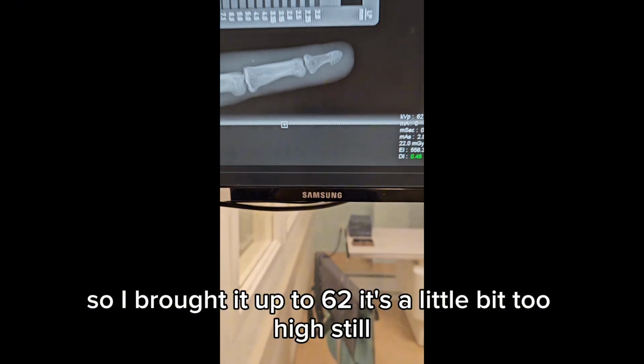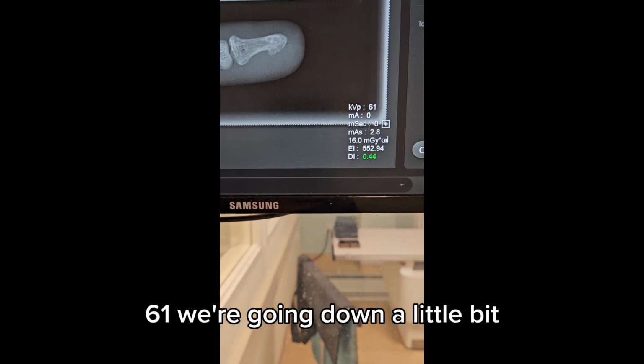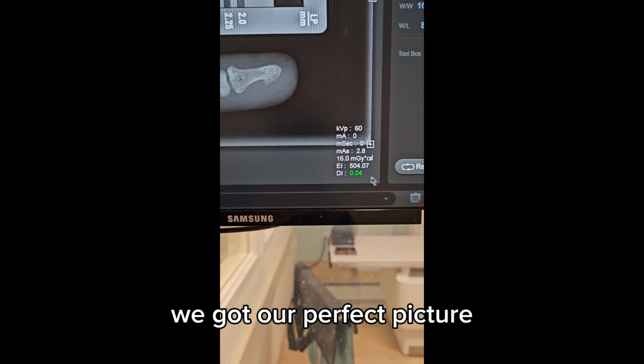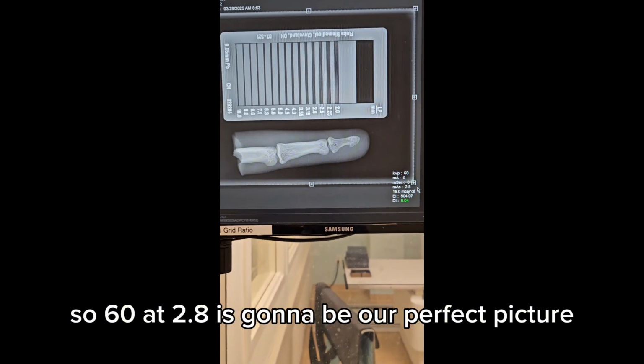It's a little bit too high still. Brought it down a little bit. 61. We're going down a little bit. Bring it down to 60. There we go. We got our perfect picture. So 60 at 2.8 is going to be our perfect picture.